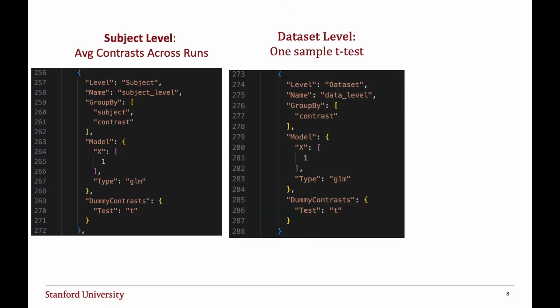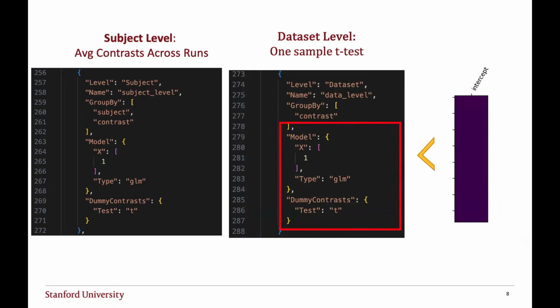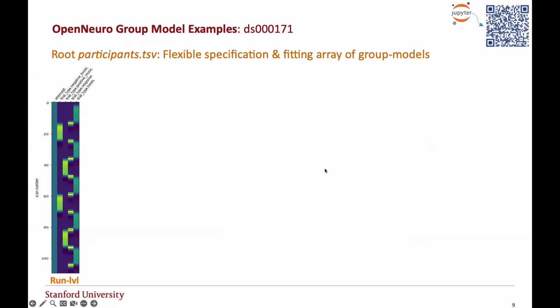And then you just finalize your data set. In this case, it's just a one sample t-test. We're just taking the mean, so effectively just an intercept. Hence, we only have a 1 in the model. I've given an example of where we're currently writing this up, but this repo here, a Jupyter Notebook, has these specs reviewed in more detail.